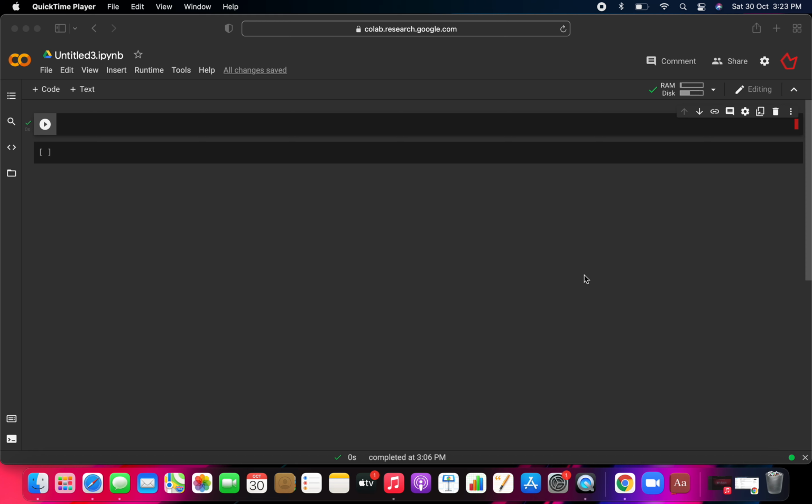Similarly, here we have all the images of the brain tumor. One folder consists of all the images of persons having a brain tumor, and the other has all the images of persons not having a brain tumor. We want to feed these images to the model so that it will be able to recognize them, and once the model is trained, it will work on real-world data. You can feed any image directly, and the model will be able to predict. This is the main problem we are doing today.